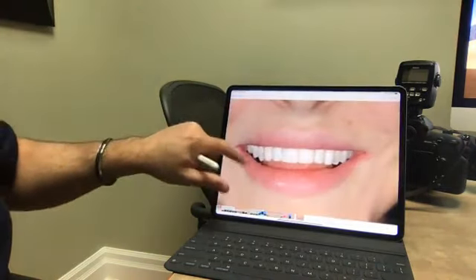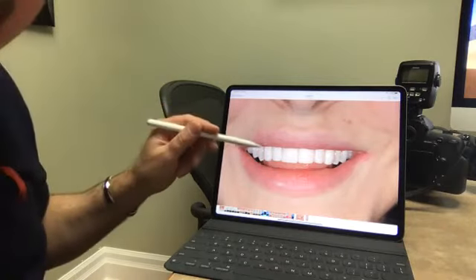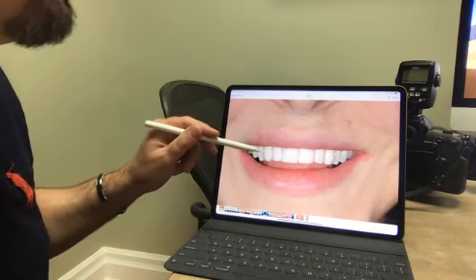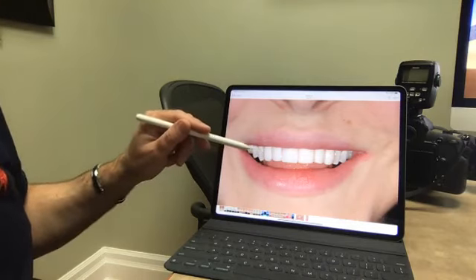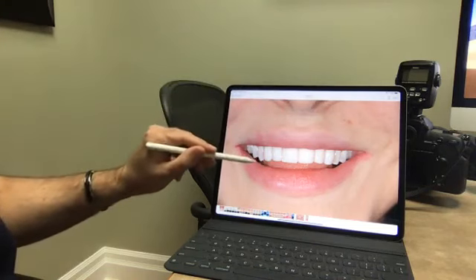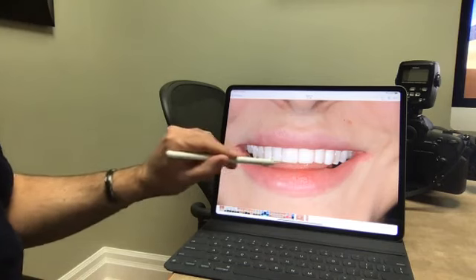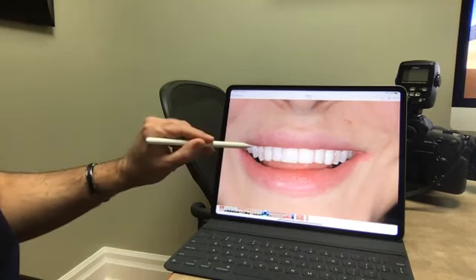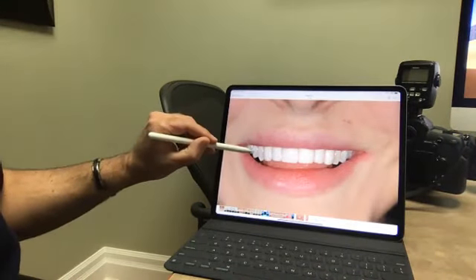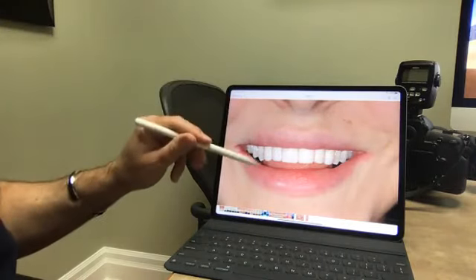So now with this, what I'd like to do is we'd look at the smile design improvements that we'd like to make for this case, for this patient. And what we would like to do is we would like to improve the incisal edge position because she has a bit of a reverse smile. You can see here the bicuspids are longer than the centrals. And we'd like the first bicuspid built out a little bit because it's a little in from the second bicuspid. The first bicuspids look like they're going in and it's kind of narrowing the smile.